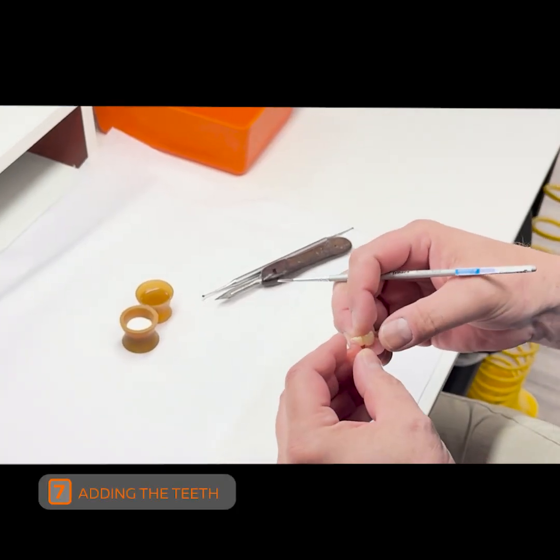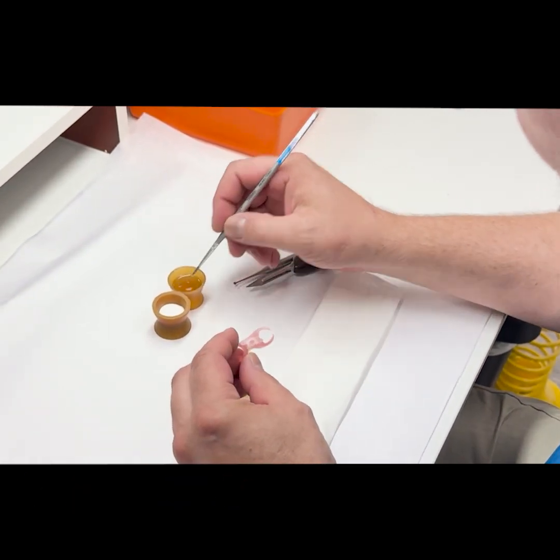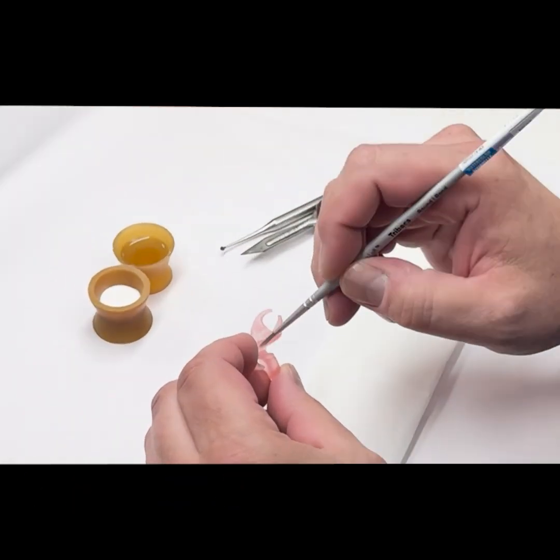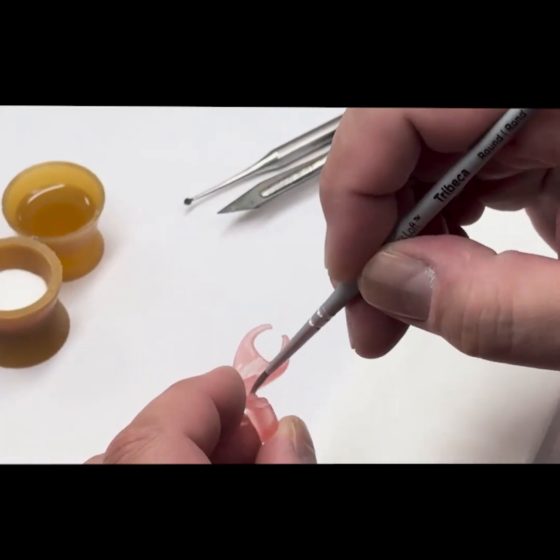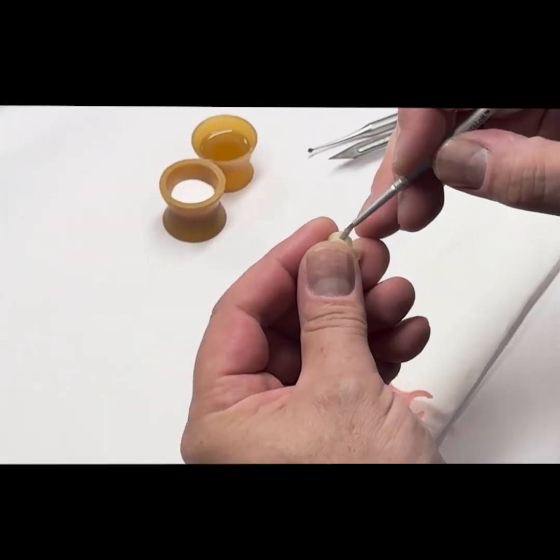Step 7. Adding the teeth. Lastly, we add the teeth to the partial. Brush monomer to the base of the partial. Use self-curing or cold-curing acrylic. Choose any shade you like.